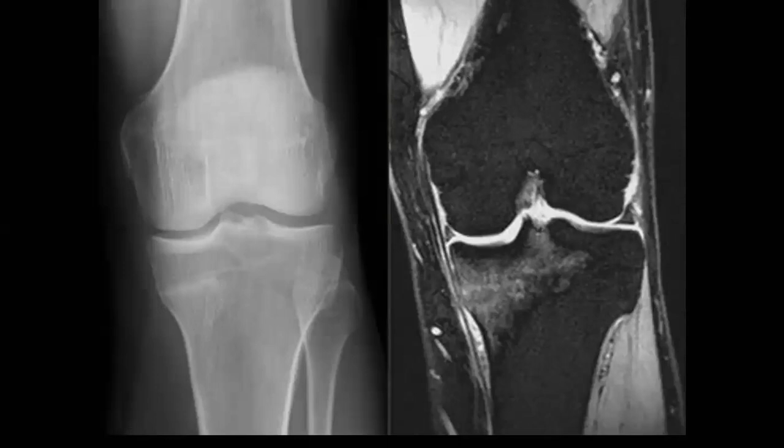Yes, osteoporosis or degenerative. Sometimes it has this appearance when it is in the femoral region. They say that it's more on the compressive side, right? And it can progress more. Your key will be to look for sclerosis on the X-ray, or to go to the MRI and the STIR and find high signal. Perfect.